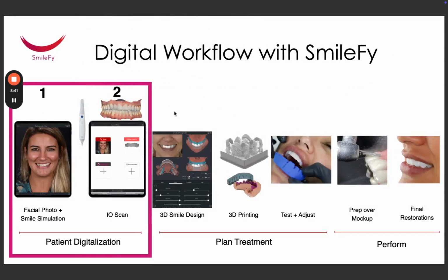Let's talk about the digital workflow. This is what we will be learning today: how to create the patient digitalization into the SmileFy software, how to add or import the intraoral scan with the picture, and export the proper files that we need. Next week, we are going to talk about the 3D smile design workflow and how to 3D print your designs.